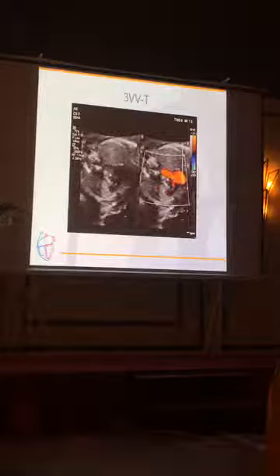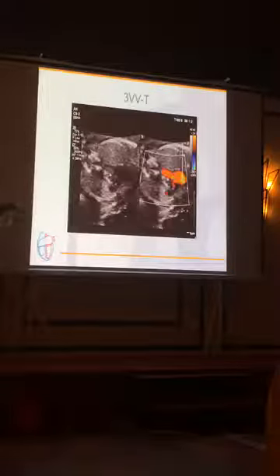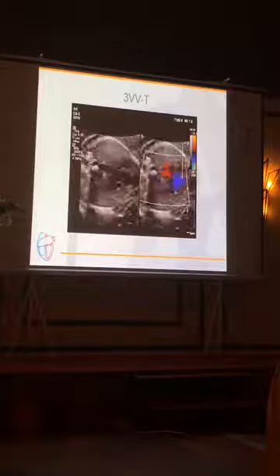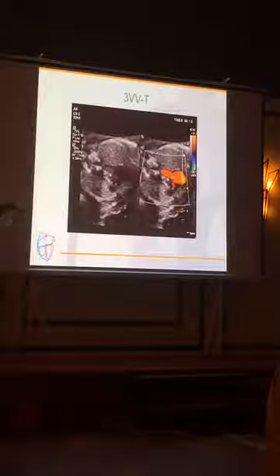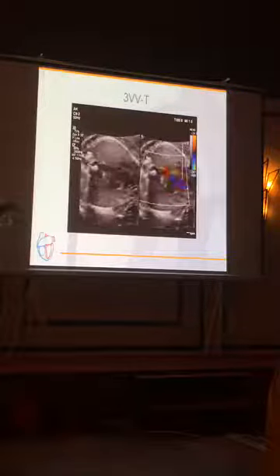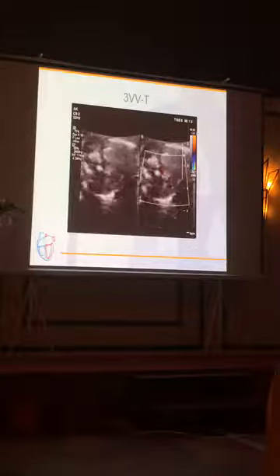So maybe someone will help me, and ask the audience if they like this view. And if they don't like this view, then what is wrong? I give you maybe 20 seconds, and later I will tell you everything. So take your time. Who says it's okay? Raise your hands. Who thinks that it's fine?